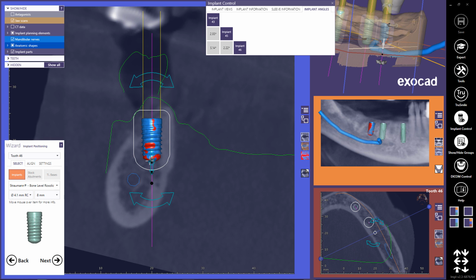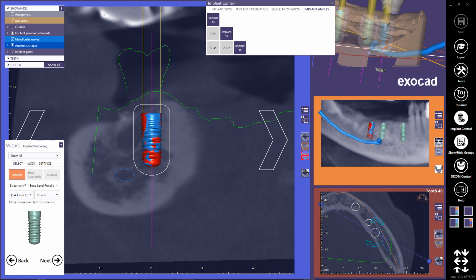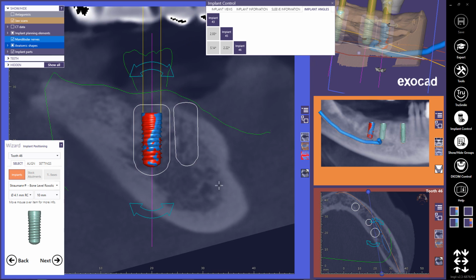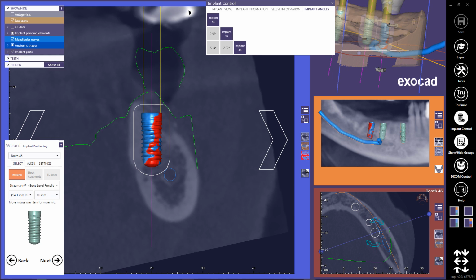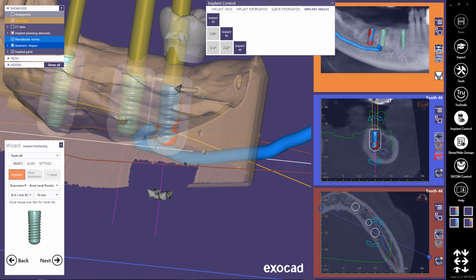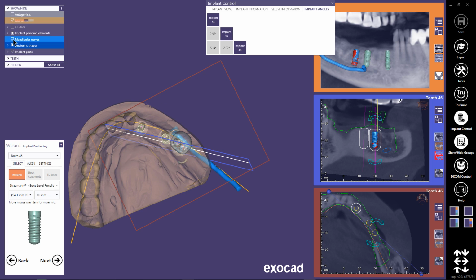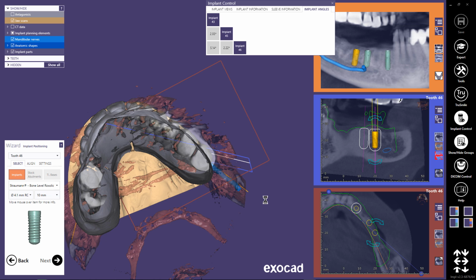Let's see if I can have a longer implant. Nah. Oh yeah, could use this one. Safe for the canal. All right. And our angles are within a reasonable limit. We can blend in all those. Looks okay for a bridge placement. Let's go further.